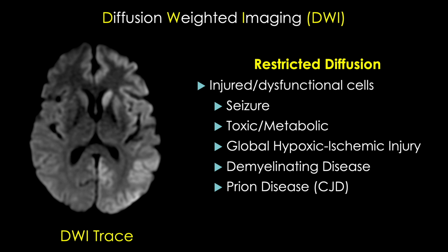I'm not sure if there's a definitive reason why this causes restricted diffusion or sole DWI trace signal abnormalities, but you can imagine that the uncontrolled proliferation of abnormal proteins within the cell will lead to cell death and accumulation of protein within the extracellular spaces, both of which will affect our water movement compared to the adjacent healthy regions of the brain.